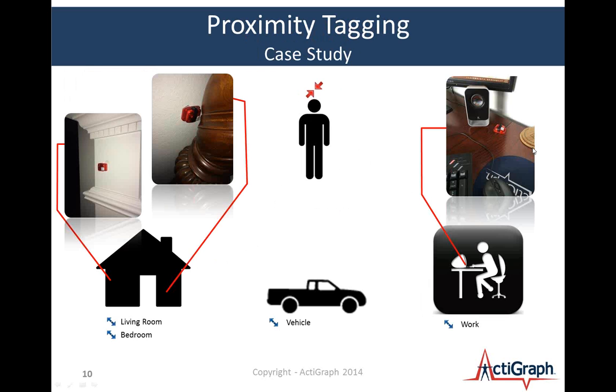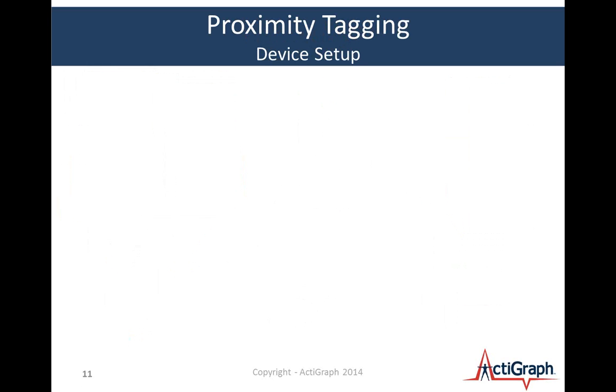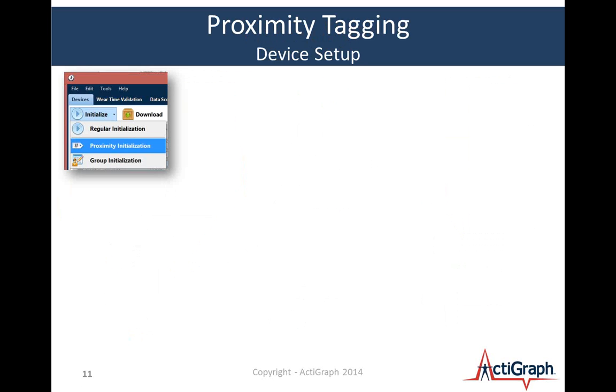So we did that study, got it set up properly, and ran the data. And so what I'd like to do now is show you how we did that preparation, that setup. So I'm going to jump into ActiLife and begin to talk about how you set these devices up for these modes. But just briefly, the slides are here.